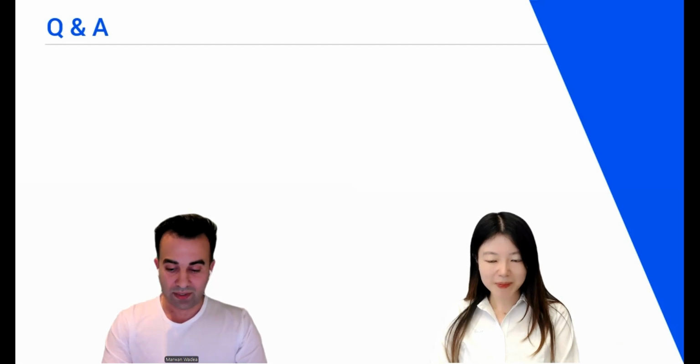I think today's topic is a bit technical, and I tried my best to simplify it. In particular, how to do the offset followed by Boolean cut to provide the space between the teeth and the denture base. And I hope I made it clear. I know it's not an easy topic. I think even the beginners might have understood so well because you explained in simple words and a simple workflow.